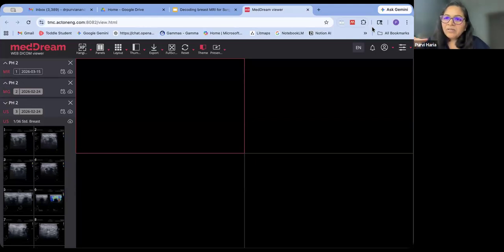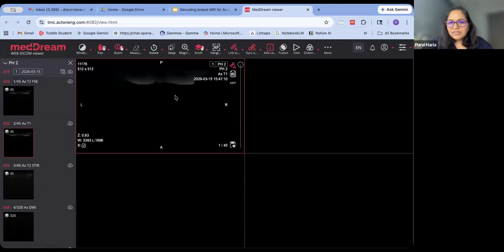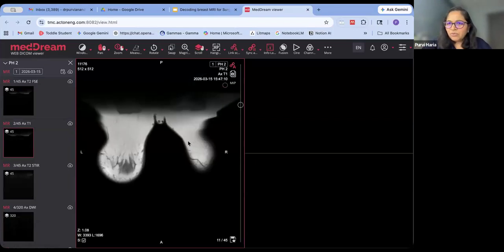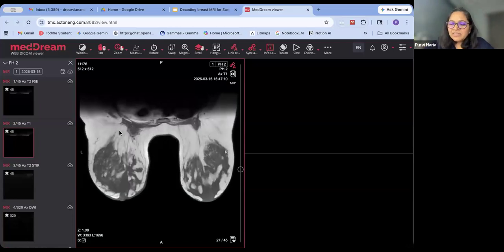Yeah. So when we do an MR, the patient is in prone position. The breast is hanging down, literally hanging down from the chest wall. Sorry, I do have an image here. This is exactly how it is. You can see my screen, right? Yes. This scan is not rotated. Most of the times we get rotated images, and it comes on the PACS. This has not come rotated, so the breast is literally hanging down.